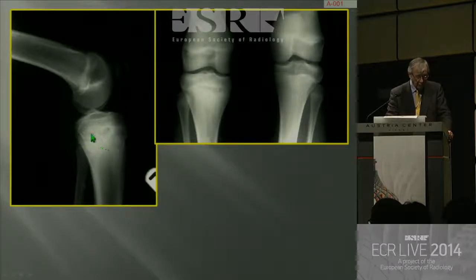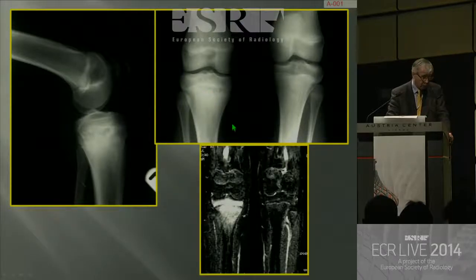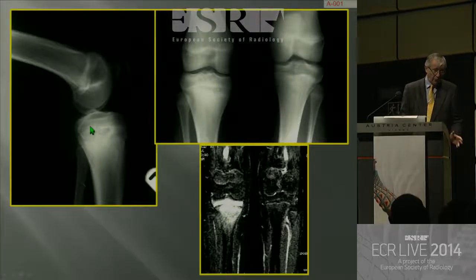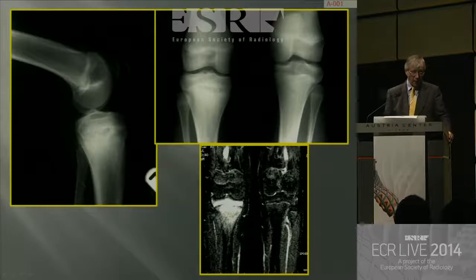This patient has metaphyseal increased sclerosis. And you can see that the epiphyses are just fusing, but there is an area of lucency as well. And here the MRI is extremely helpful because it shows you a very marked increase in signal on the STIR sequence, confirming that this is an osteomyelitis, a rather more chronic osteomyelitis. But you can really put that diagnosis in the frame from the plain films, and the MRI is really there to confirm that.